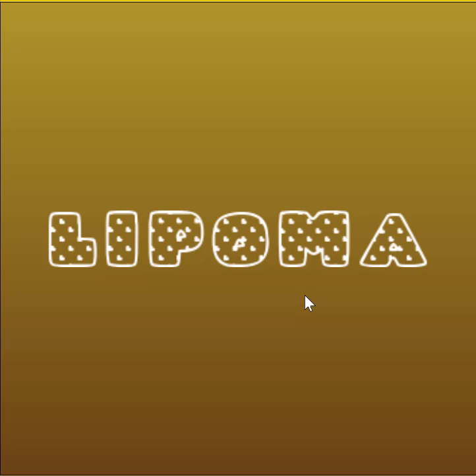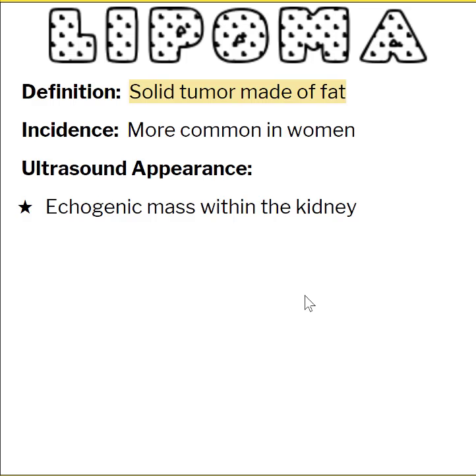Our last benign renal tumor that we need to talk about is the lipoma. Lipomas can be found anywhere within the body. Lipomas are made of fat, so it's a solid tumor made of fat. These are more common in women, and because the tumor is made of fat, we usually see an echogenic mass within the kidney.